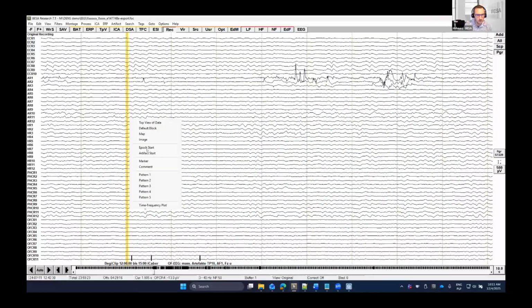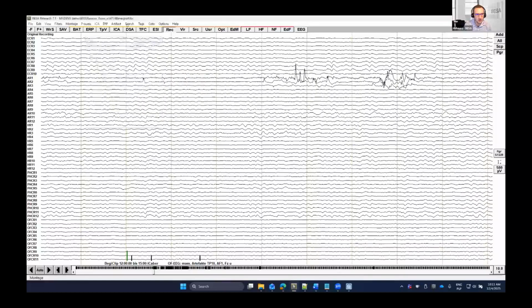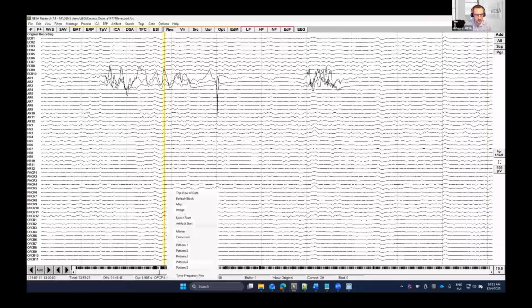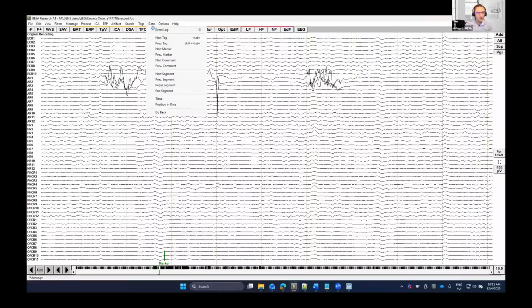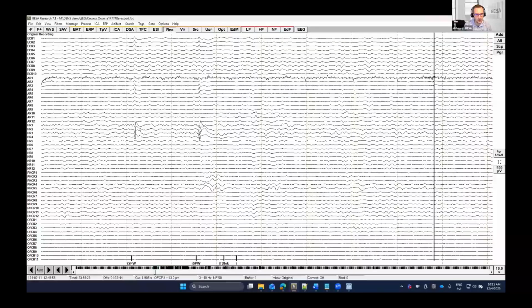So I will just put a marker here. And for our webinar, I will make it very short. So I will go to position in time at 1 p.m. Just put the marker here. And now we just go to event. I have already marked a spike for you, so we don't need to hunt for it. We just need to go to the first spike I know. Here we have a spike.